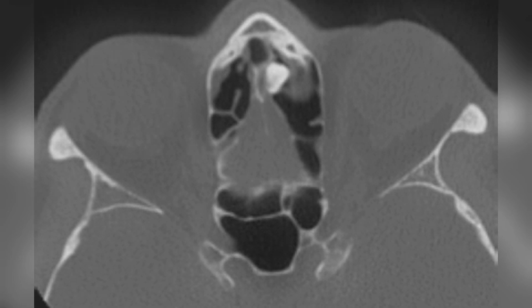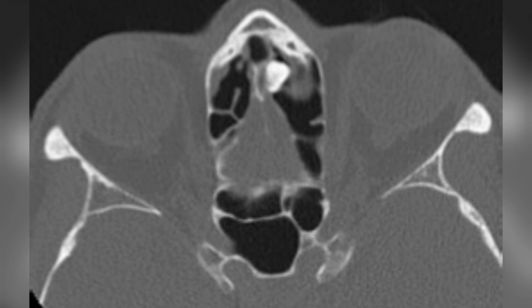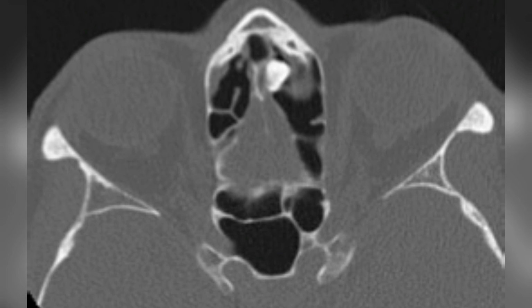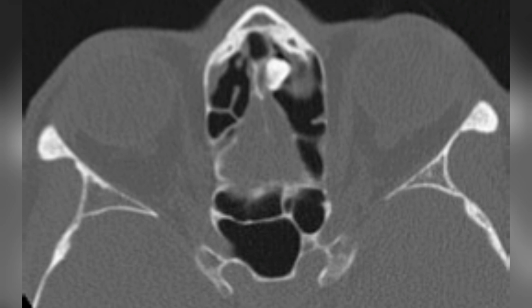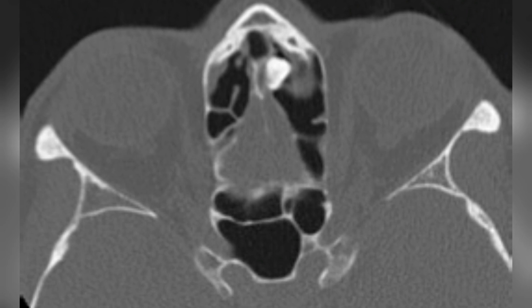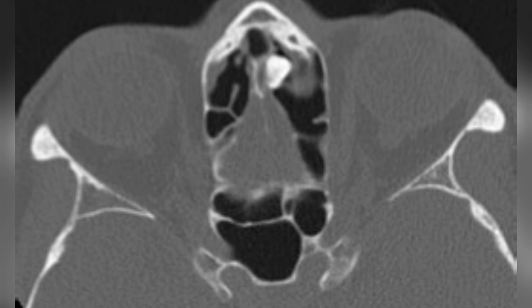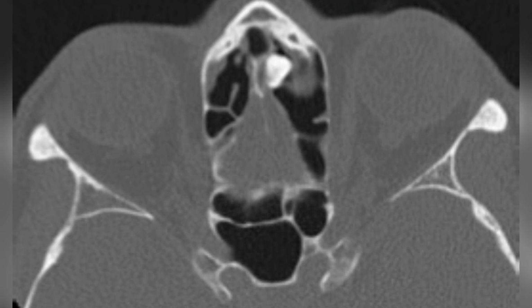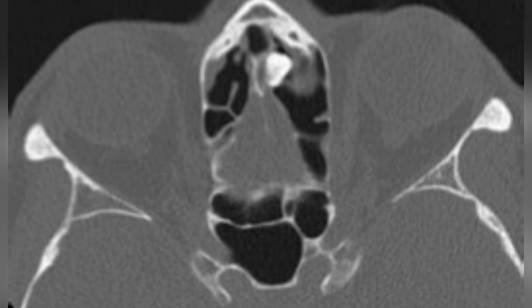In today's video, we will explore the radiological findings and clinical aspects of a sinonasal osteoma. Using a case study of a 66-year-old male patient with nasal congestion, we'll delve into the imaging characteristics, location preferences, and clinical relevance of this benign bone-forming tumor. Stay tuned as we review both axial and coronal CT images and discuss key diagnostic clues.